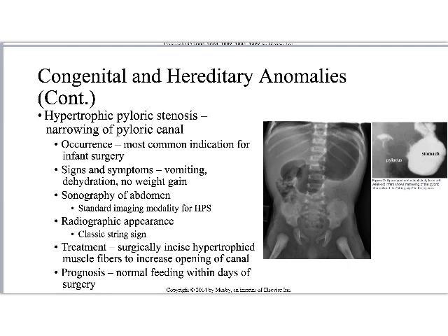And so in that image on the right, I included it because we see the barium. It can't get through the pylorus, and so there's this little string of barium that was able to worm its way through because it's stenotic. It's closed on. So we have just this little string of barium that's getting through. That's a string sign in this case for hypertrophic pyloric stenosis. Why? Because it's in the area of the stomach. So it's going to be important that it's a string sign, but also where's the string, right?